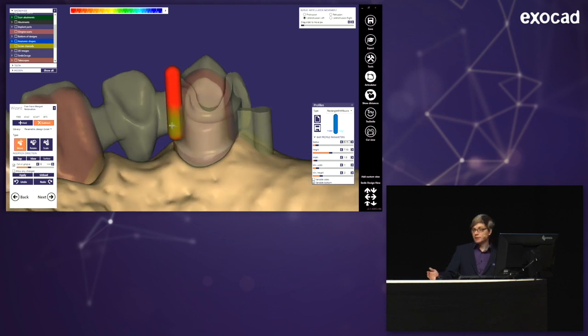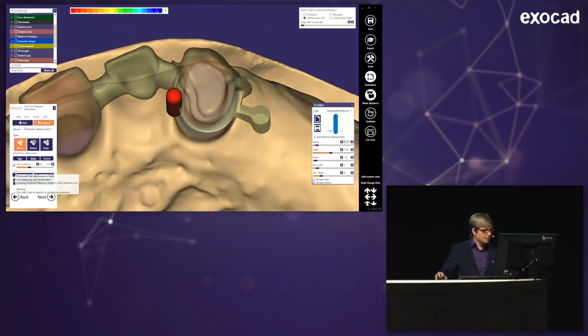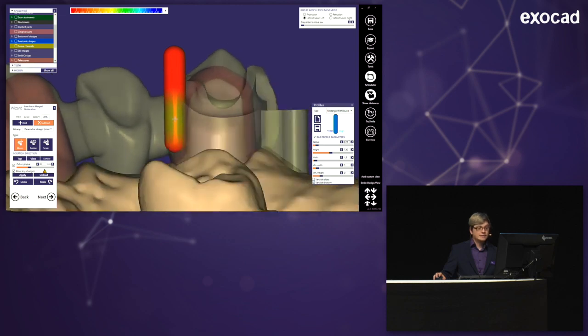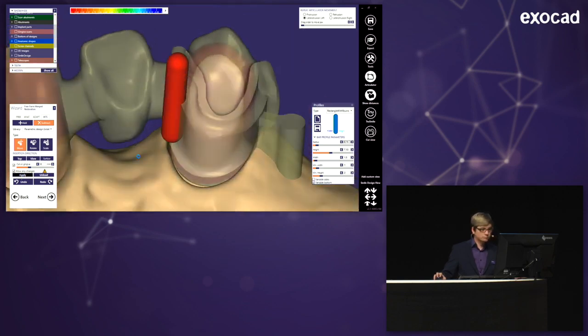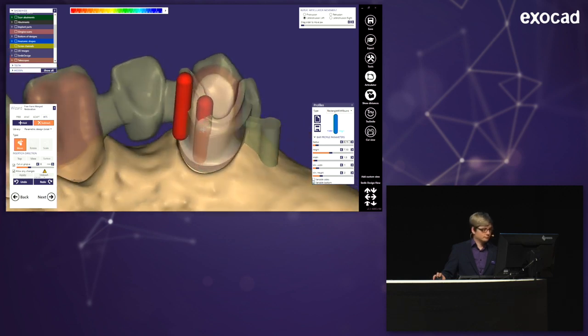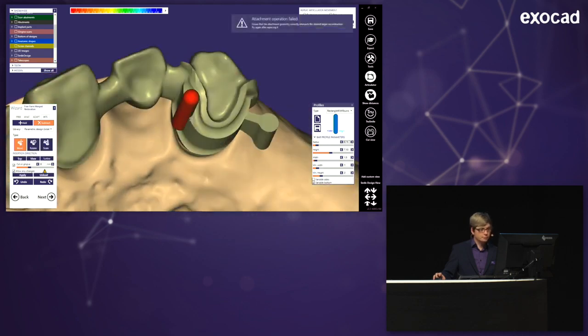And normally, if you go through the minimum thickness, the software will build it up again because you can't hurt it. But if I apply the allow any changes, I actually can hurt the minimum thickness. And I chose a minimum thickness of 0.6, so it's already way too big for a metal crown. So if I do that, it will work in the end. But it takes a bit longer than you're used to. Oh, it will not work in the end. OK, I'm placing it again.